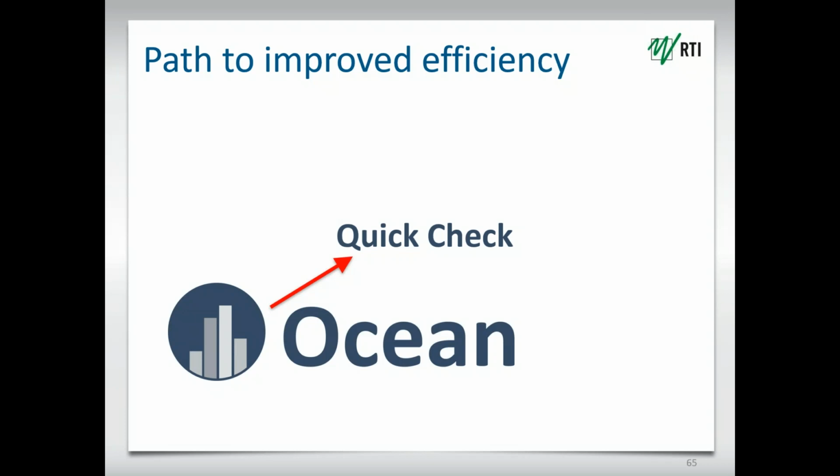If we want to customize more, or if there is a need to do even deeper and more serious work, we can then continue from Quick Check and bring Ocean Professional into use, where we can customize it to a much higher degree and where we have much more possibilities.